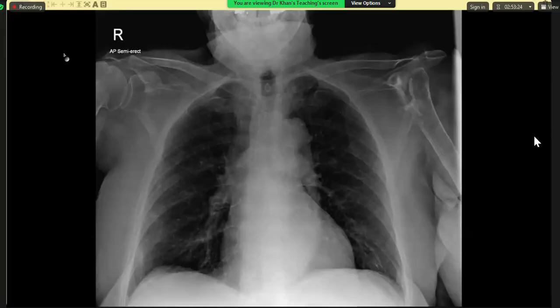I would like to take the history in this patient, whether the patient has any previous surgery or any history of previous imaging, to rule out syringomyelia, but that would be more of a bilateral case, or it could be some advanced case of tuberculous arthritis. I would like to compare with the previous and go accordingly. I believe that instead of systemic, it is more of a localized process.